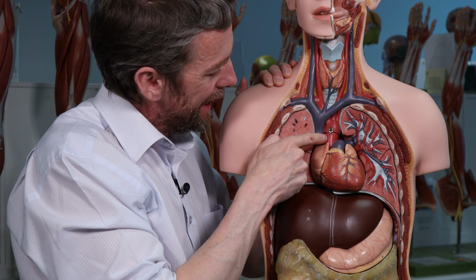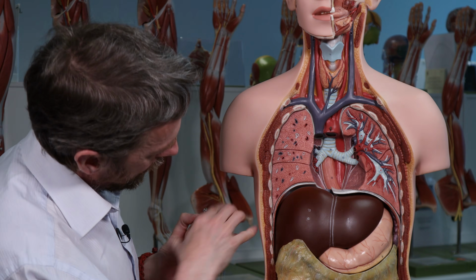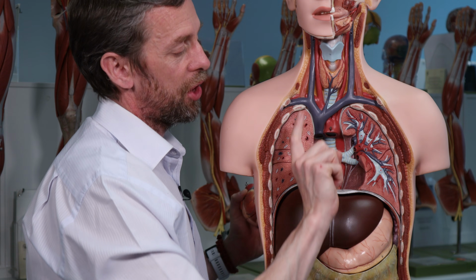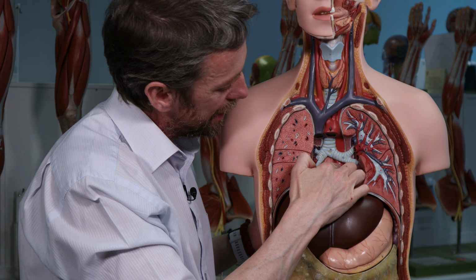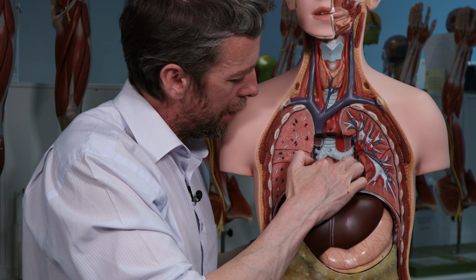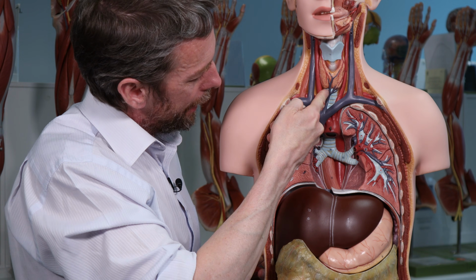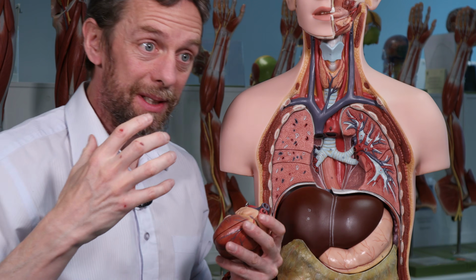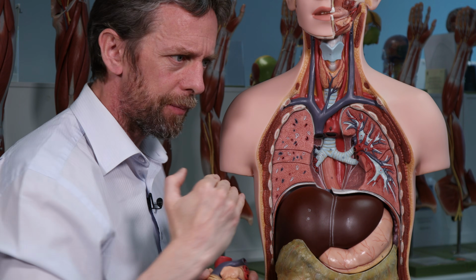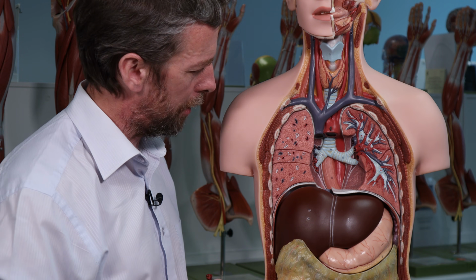The aorta then, here's the ascending aorta, leaving the heart, and then it loops. We can't really see too well, but the arch of the aorta is curving over to the left and posteriorly, and then it runs to the left and a little anterior of the vertebral bodies and down there, right? We can see the airway and its relationship to it. So we take this 3D stuff, we get hold of it inside our heads, we look at a two-dimensional image and we apply it and we try and work out what's what.